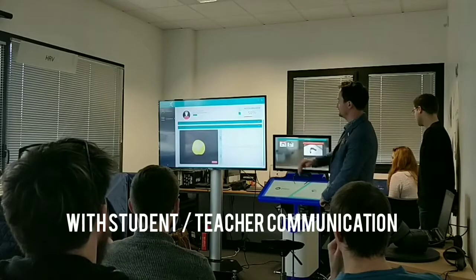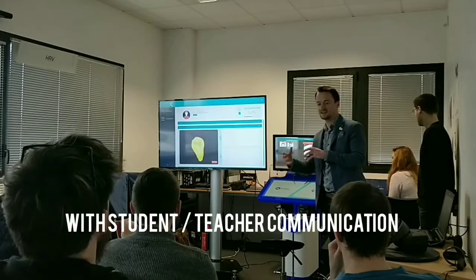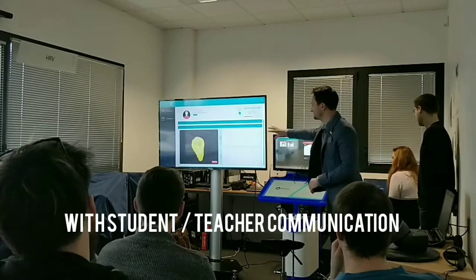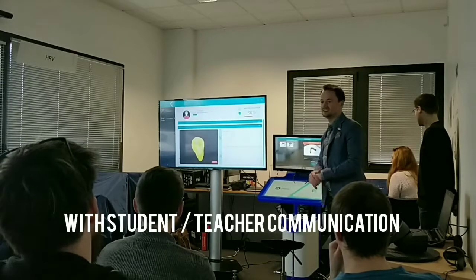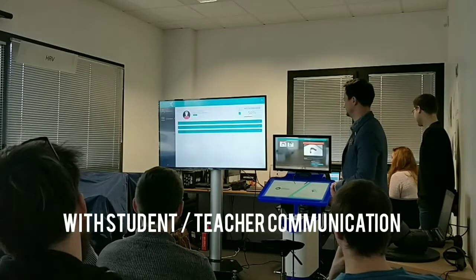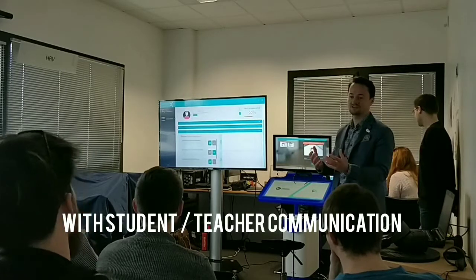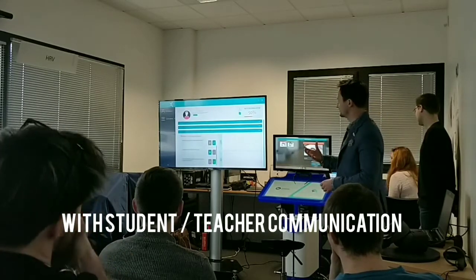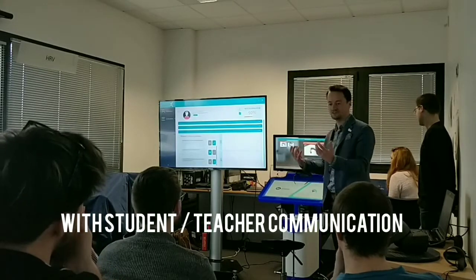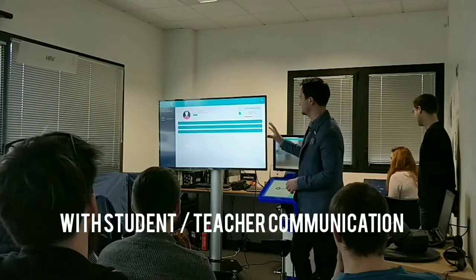We then have a 3D view of the solid, and this can even be used to export the work and 3D print it within the university. Here the student can leave some comments which their teacher is going to see when they come to it. And finally, we also see the questions that we responded to on the simulator, and this gives us a chance for some self-reflection as a student to think after the treatment, what did I do well and what could I do better? All of this is saved automatically.